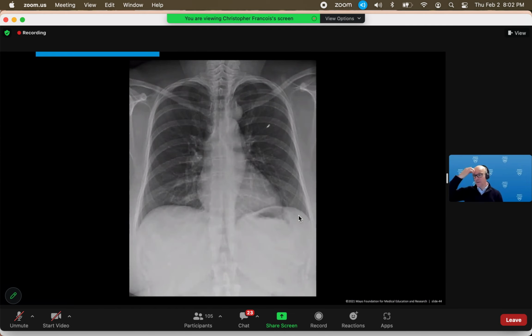So this is a 45-year-old with high blood pressure, and they got a chest X-ray. Osama next, and we're at the 1 hour mark about. Yeah, we'll go through the congenital heart disease cases and then maybe a couple more of the non-congenital things.